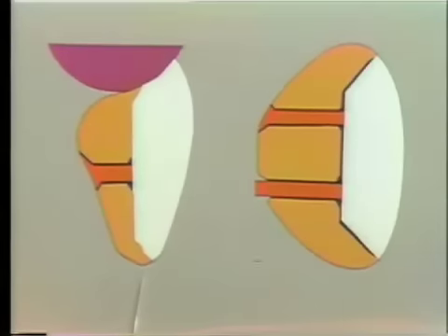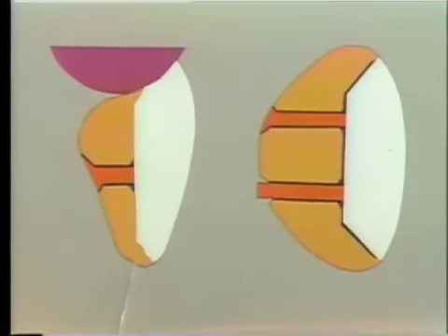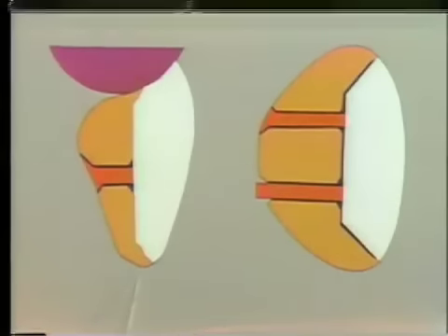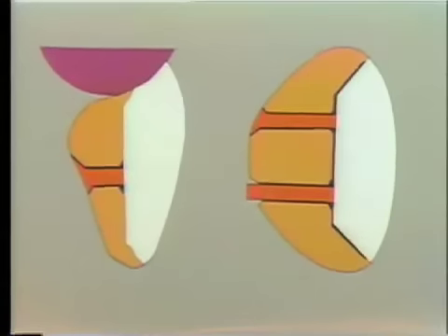Notice the incisal here, where the gold is brought down to protect the porcelain at the edge here, and how the porcelain has been hollow ground just in here to give an extra bulk of gold across the incisal edge so that it absorbs any stresses which fall on here. I think you can see that on an impact on any hard food matter, it would be the gold which would receive the first stress in this situation and not the porcelain.